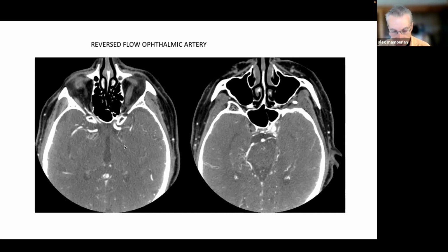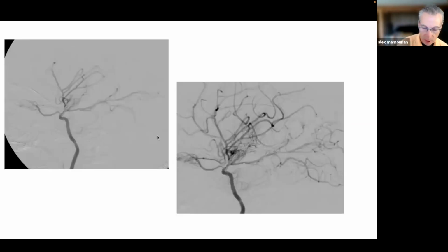And that's what's providing flow to the middle cerebral artery in this patient, along with probably cross flow from the anterior communicating. So again, circle of Willis along with external supply can support flow. So again, this is another pattern of collateral flow, comes from the external carotid artery.